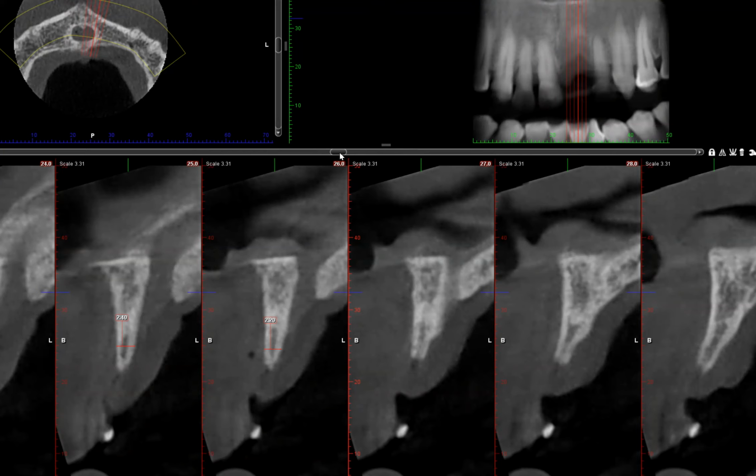So what does that mean? We just went from 6 millimeters to about 2 millimeter. That's a loss of 4 millimeters, right? And in terms of percentage, you've lost about 2/3 of the ridge thickness.